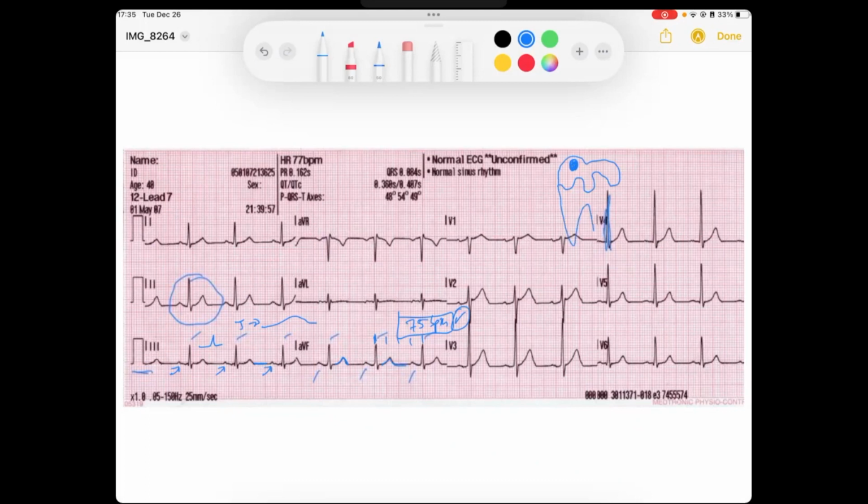And then here's my ventricles. And I know that when the atria fires and depolarizes, it's going to depolarize from the upper right-hand corner down to the lower left-hand corner, which means our P wave should be going down and left, which means down would be positive P waves in AVF. There's our positive P wave in AVF. And leftward would be positive P's in lead one. So that's how I can check the sinus rhythm.